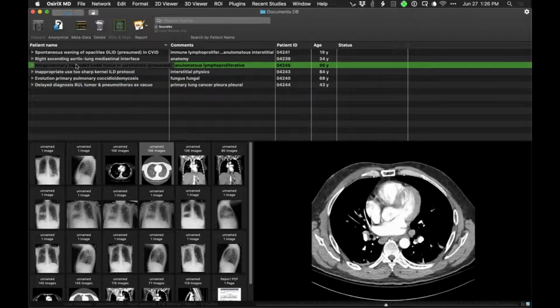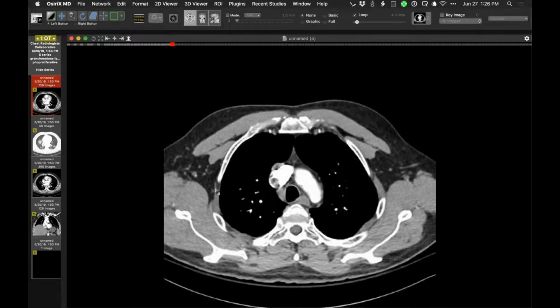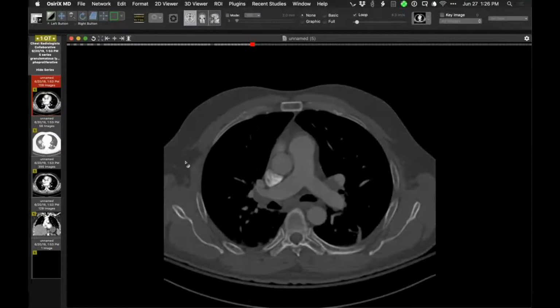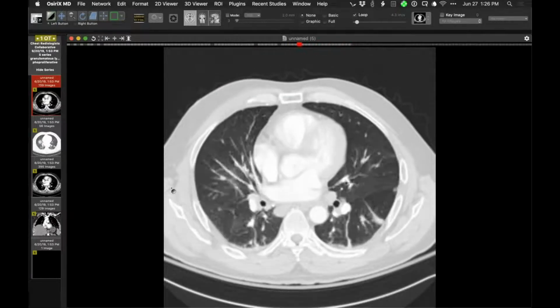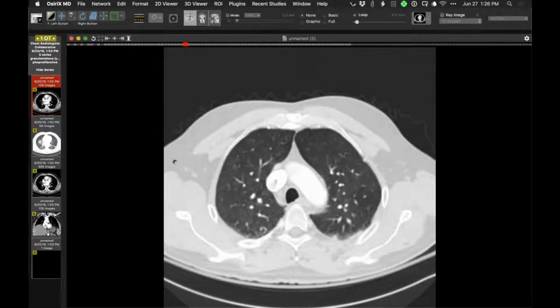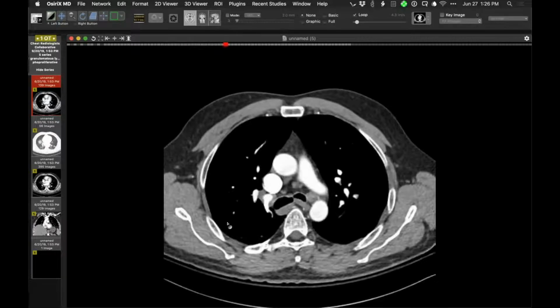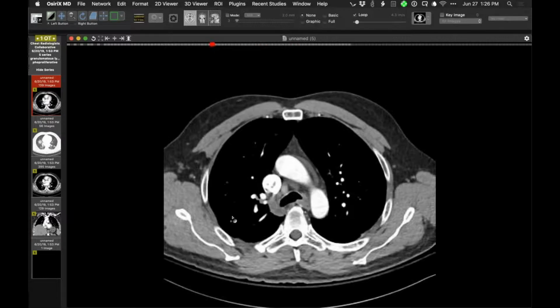And I think, oh, I'll show you this one real fast. So this is an interesting case in this sense. This patient had a CTPA for PE. There's no PE, but there are a bunch of findings here very typical of sarcoidosis. So there's scattered nodules in the lungs, a few of them. So for example, here, and there were a couple more in a few places like there. There is a fair amount of nodal tissue, so enlarged hilar, infrahilar, and mediastinal lymph nodes, not particularly big.